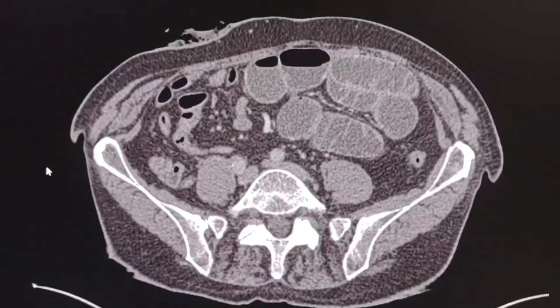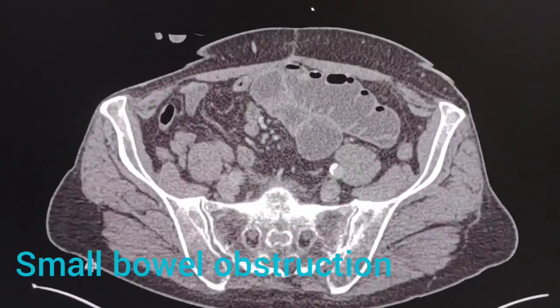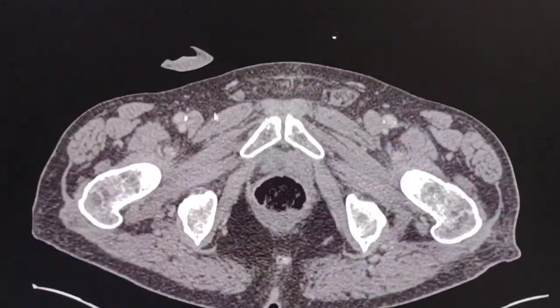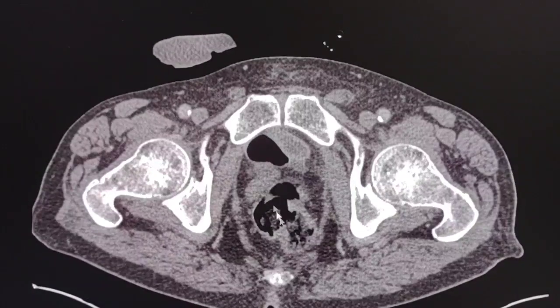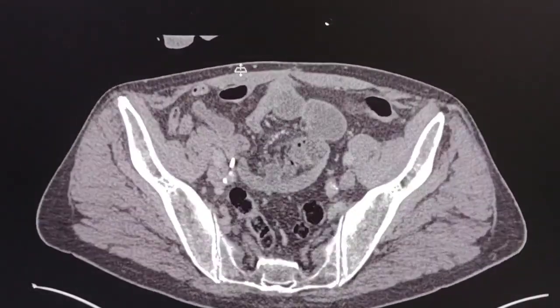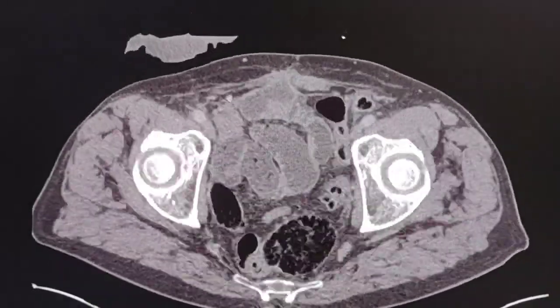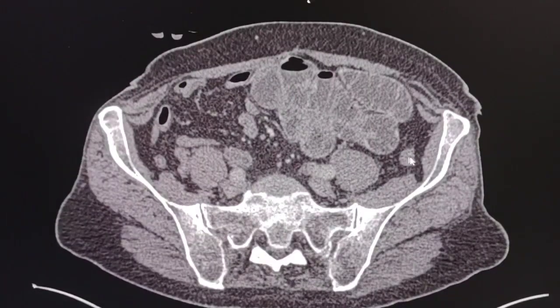This is always a challenge for the radiologist to find the transitional point where exactly the bowel is obstructed. First of all, we have to see if there is small or large bowel obstruction. As we can see here, here is the anorectal region. There are some feces here. There is some diverticulosis, but anyway, the large bowel is not dilated.